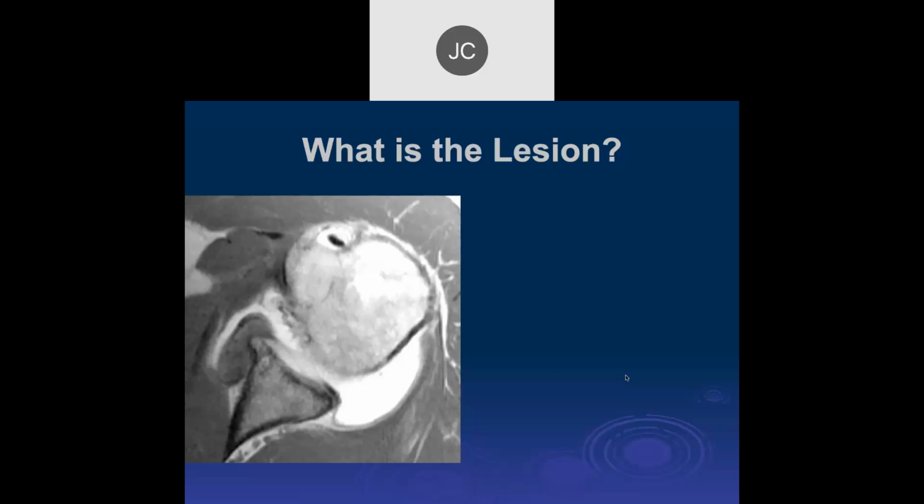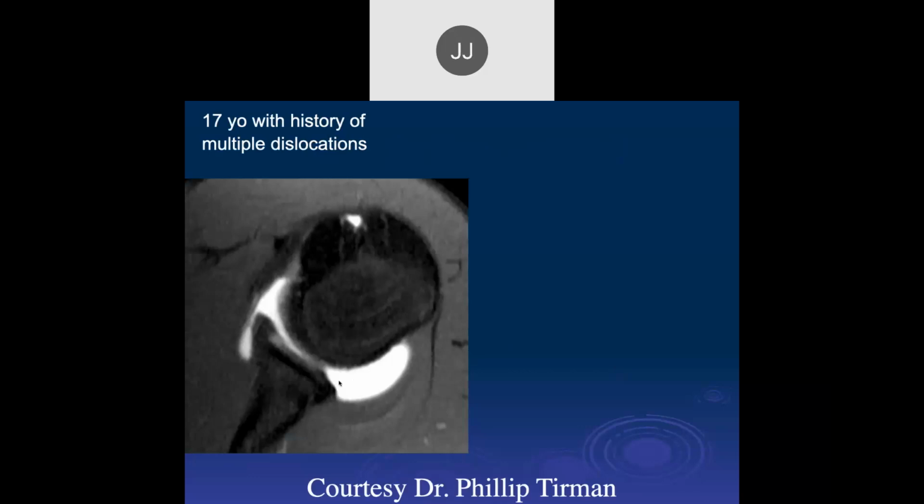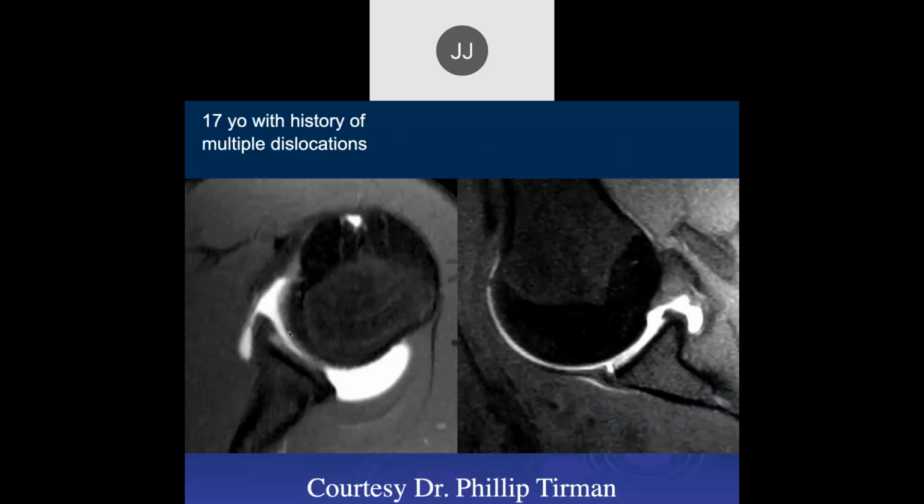What's interesting is that you're using dye and it's not helping you much. Well, here we really don't see the anterior labral tear with the contrast, but when we go to the ABER view, we do. You're probably right. We would probably see this just fine with joint fluid, not putting in contrast, if we did the ABER view without putting contrast in. But I don't know anyone who's done any studies just using the ABER view without arthrography.